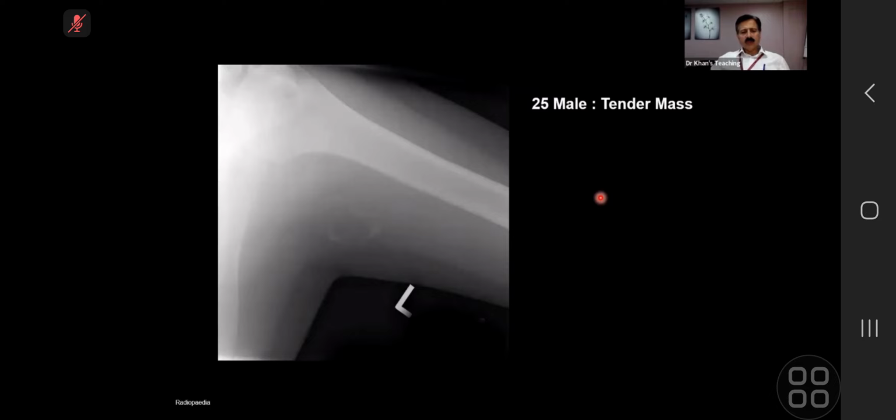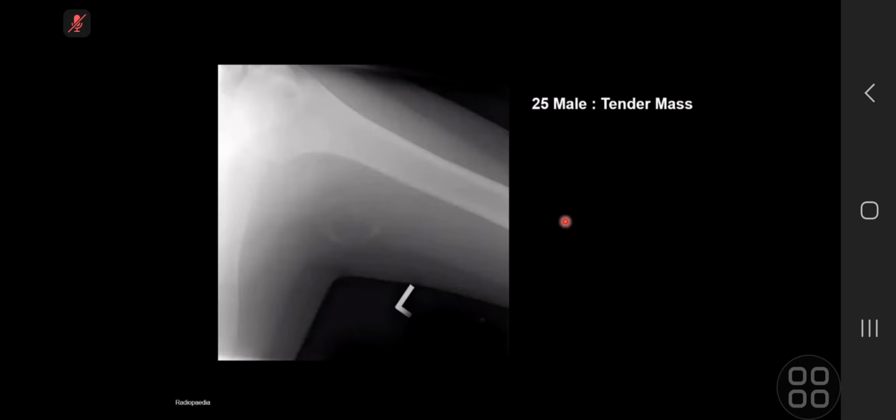Last 3 cases. What do you think it is? There is a history of trauma. Probably hemorrhage then. Hematoma? What do you mean hemorrhage? Well, there's an ovoid soft tissue mass with some peripheral calcification. If there's a history of trauma, well, okay. So it's in my differential that it could be a hemorrhage, because chronic hemorrhages can calcify. Another possibility is some post-traumatic heterotopic ossification.